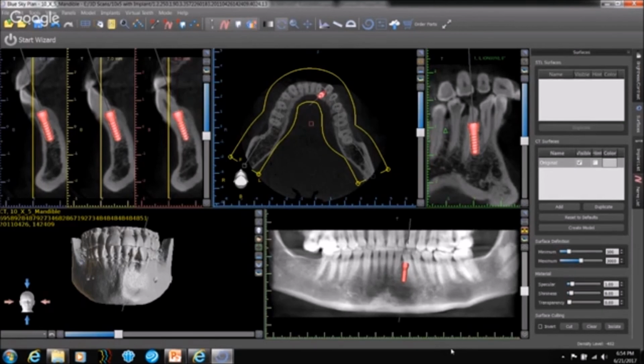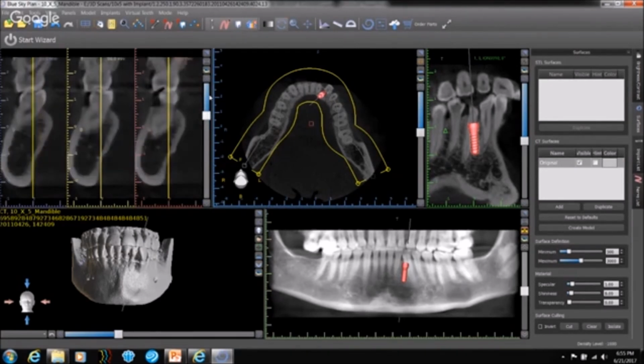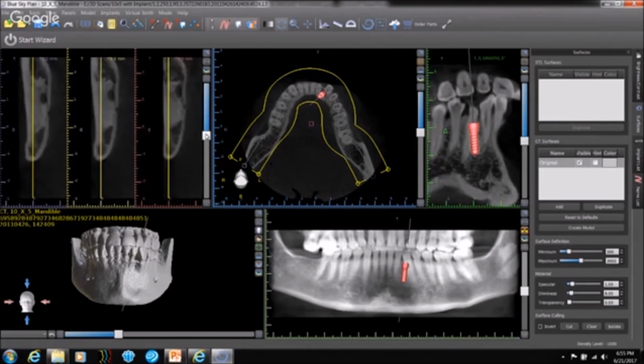Okay, what is the radiopacity on the left distal to the 17 area? So this is a dense bony island. This is the one that I brought up, and I actually showed it. Let me go to that area, and there you go.